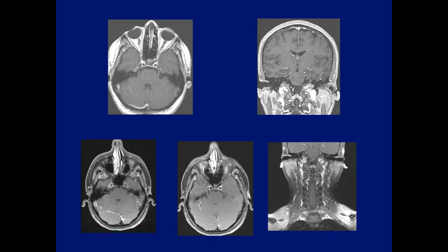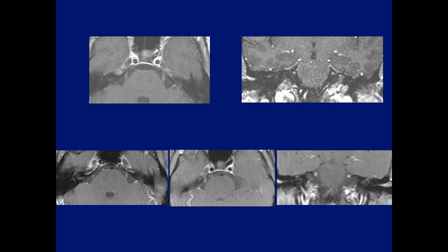I guess there's no takers for these images. I just wanted to use this format to show the problems that we have in looking at images in the clinical work. How about these images? Anybody see anything? I'm not getting any responses. Anybody watching this talk?